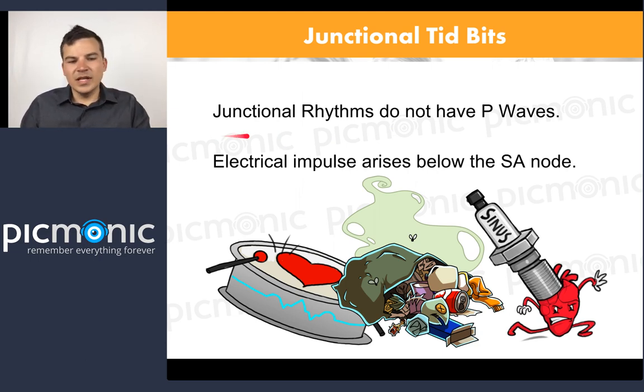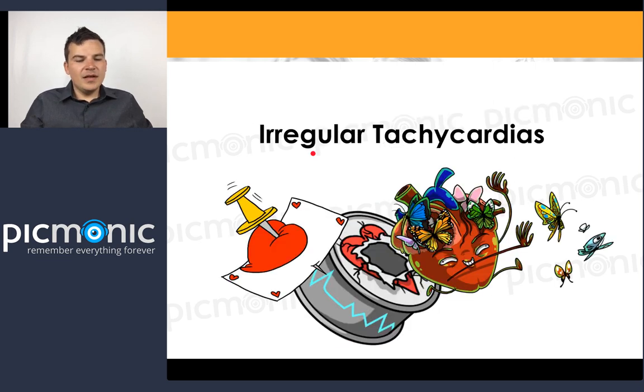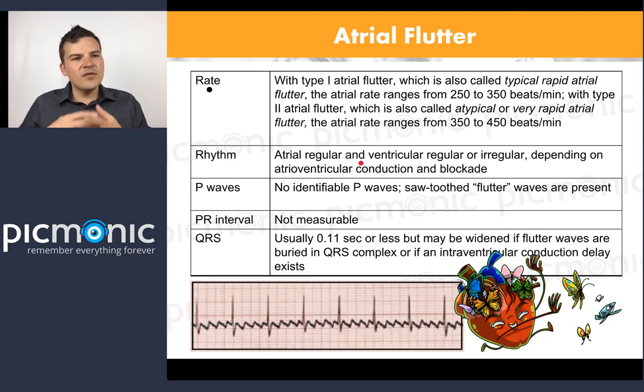And that's what's important. That's why we call sinus rhythms sinus. Now let's talk about some fun arrhythmias here. These are fun. When we talk about the irregularities, the weird ones, these are ones that are hard. These are ones that are so hard to really get down because they never appear the same way. You're going to get a rhythm and it's going to look different, but you just follow the process and you'll get it. So let's look at atrial flutter here.